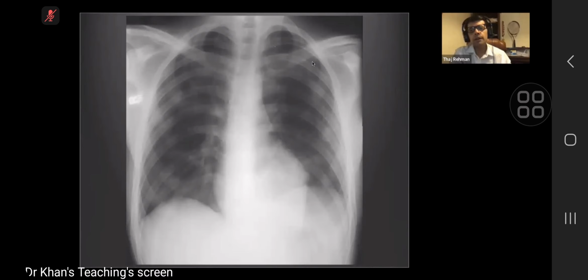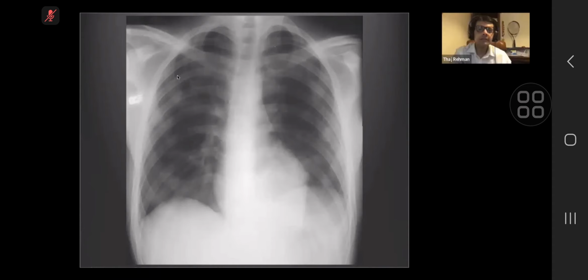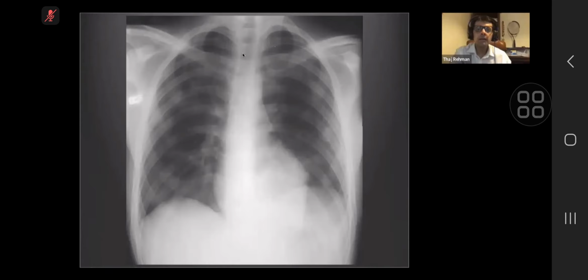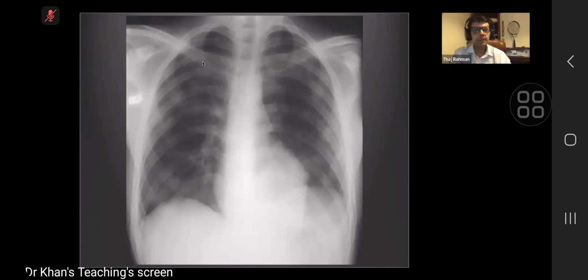Can you see the visceral pleural line? Yes, I think there's a left pneumothorax there. Is it just left or is it bilateral? Yes, on the right too. So biapical pneumothoraces with the multiple nodules, I'd be suspicious of osteosarcoma metastasis. Correct. Osteosarcoma metastasis, biapical pneumothorax. Identify the visceral pleural line. This is crucial for the rest of your life and for the exam. It's very subtle, it's tricky, but I've made the X-ray soft so that this can be picked up.